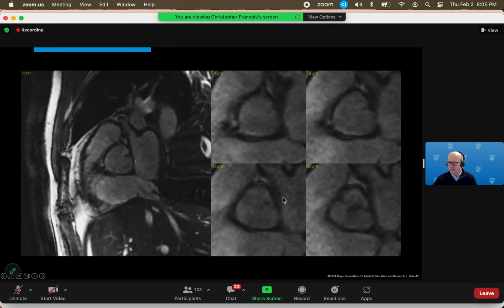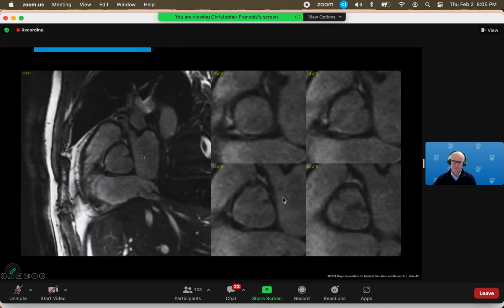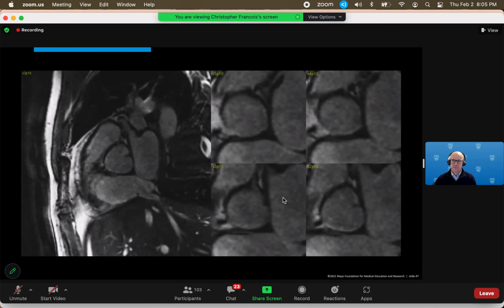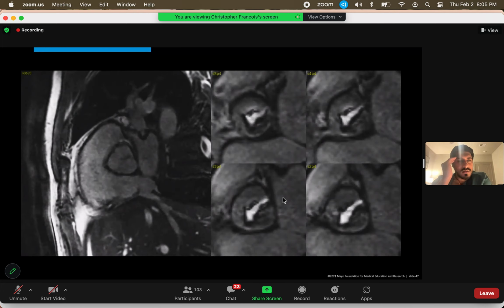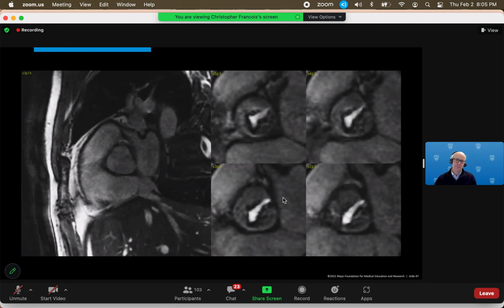What is this commonly associated with? I know this is associated with Turner's. Okay. What else? Look at the others. Associated with aortic stenosis. Yeah. Sometimes coarctation of the aorta. Yeah, coarctation is the other big one that it's associated with.